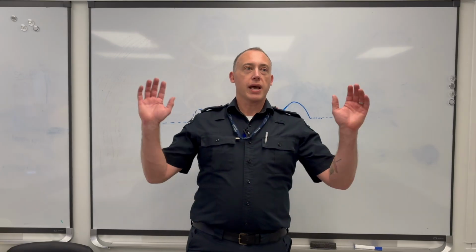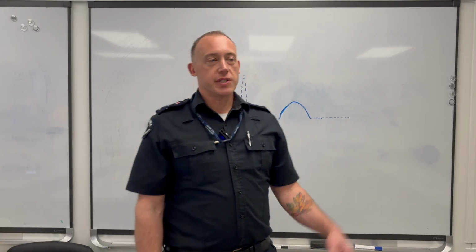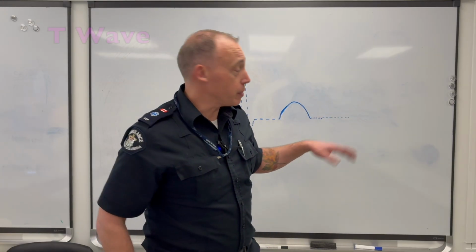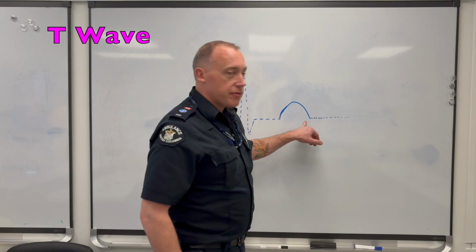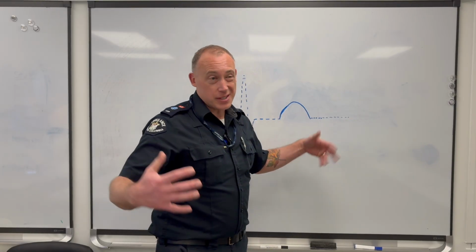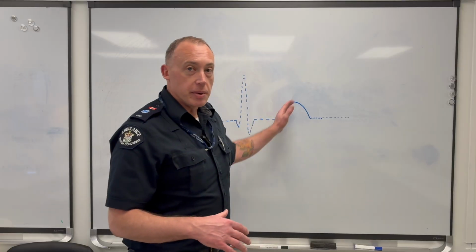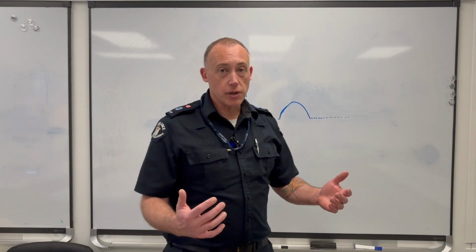extravaganza. Okay, we are almost done this relentless crusade through the PQRST and normal stuff. So we're just going to wrap up with the T-wave. The T-wave follows the ST segment, which kind of makes sense. And it can be of a lot of different shapes. Normally it's going to be upright and symmetrical. That's what it should look like normally.